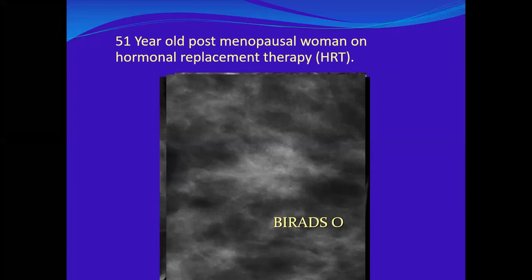Focal fibrocystic change once she is on hormonal therapy. Excellent. Hormonal therapy. Yeah. What else? Stromal fibrosis can be also. Okay.